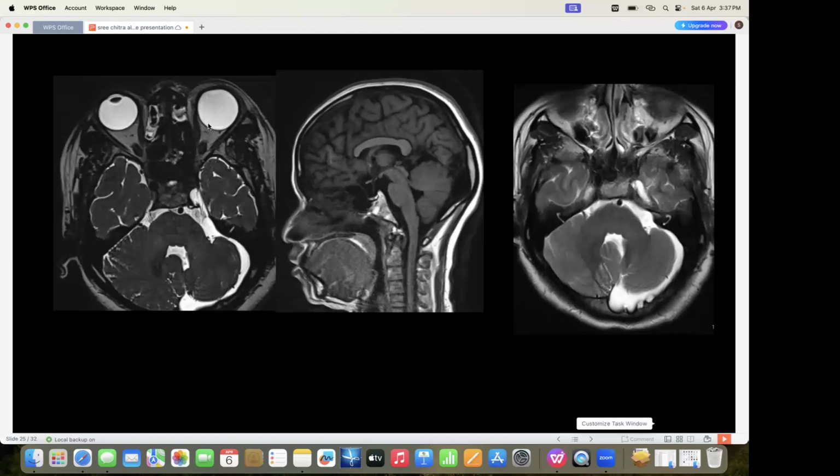Like you told, the enlarged globe could be a posterior staphyloma, yes, with cerebellar hypoplasia or dysplasia, with corpus callosum dysgenesis, especially in the anterior aspect, and absent ICA flow void on the left side. So is there any correlation for all these things? And on leading history, there was a facial patch, but at present we could not make it out. And she herself is a dark female, so we could not appreciate any discoloration also.